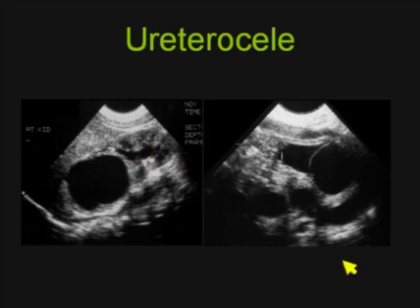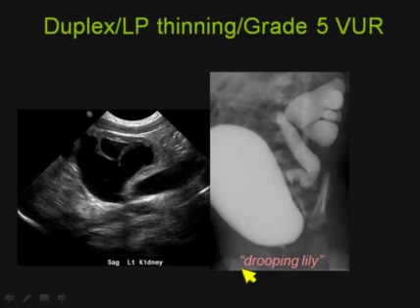As we look at the additional images, here's the bladder. This is the continuation of a ureter that arose in the region of this large cyst and was actually a duplication cyst that terminated in the bladder as a large ureterocele. The fullness of the lower portion of this duplex kidney is most likely because of pressure from this dilated ureter, although there certainly is a higher incidence of reflux into the lower pole of a duplex system.